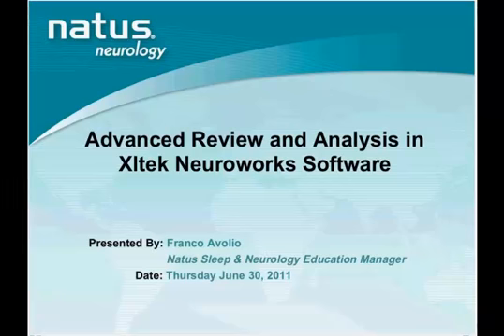The software that I'll be using today to demonstrate the features is NeuroWorks version 7. So if you do not have the latest version of software, you may notice some of the features are not available in your version 6.1 because I'm using a newer version.